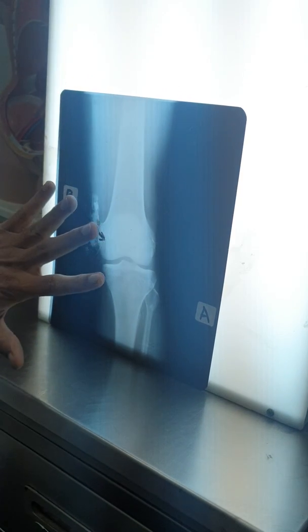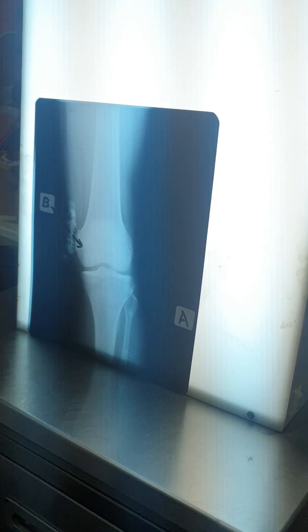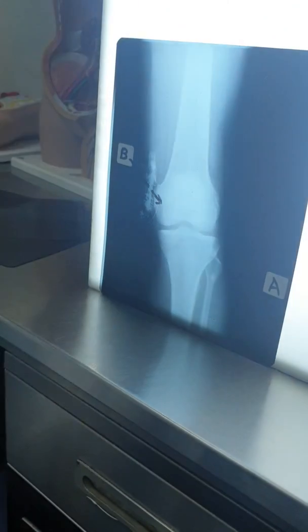So just identify this area, and you may have to name this area A and B, or something like the anterior superior iliac spine. Name the structure attached to it, or iliac crest, or like that. One more thing I'll tell you: this is what you see in adults above 25 years. But in those less than 25 years, sometimes the epiphysis does not fuse.